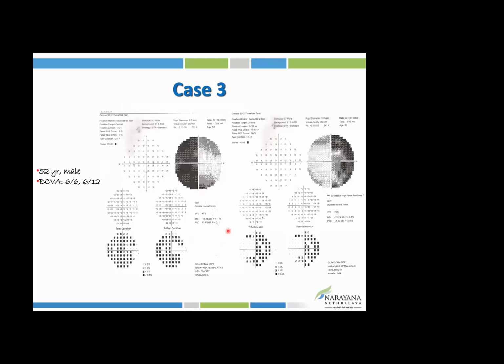Again, we see the vision in one eye is less, but classical field defects, temporal fields of both eyes are affected. So this is a bitemporal hemianopia, and the only time that can happen is position 3, which I mentioned to you when you're looking at a chiasmal lesion. But before that, take a look at the optic nerves. You must have missed something there. What we noticed is that the patient had temporal pallor. So we know there's definite compression happening of the optic nerve, and the diagnosis was a pituitary adenoma.